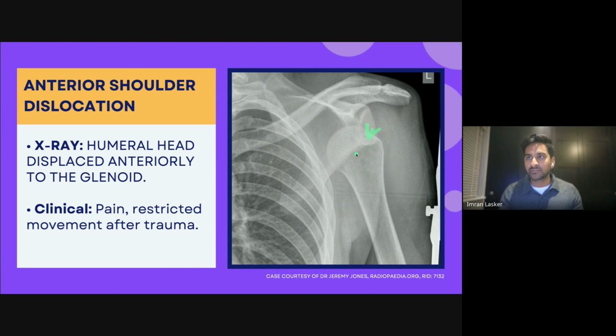These two impact. So sometimes it'll relocate by itself, and you think, oh, it's fine, mate, no worries. But actually, when you look at the x-rays, there's a massive dent sitting there, and sometimes you even get a fracture there. So it's very, very important to be aware of those two structures when you're looking at dislocations, because even when it's gone back to normal, you can still see signs of the previous fracture. The other reason why this is important is because if you do have fractures in those particular areas, it means that you can be more predisposed to getting anterior dislocations in the future.